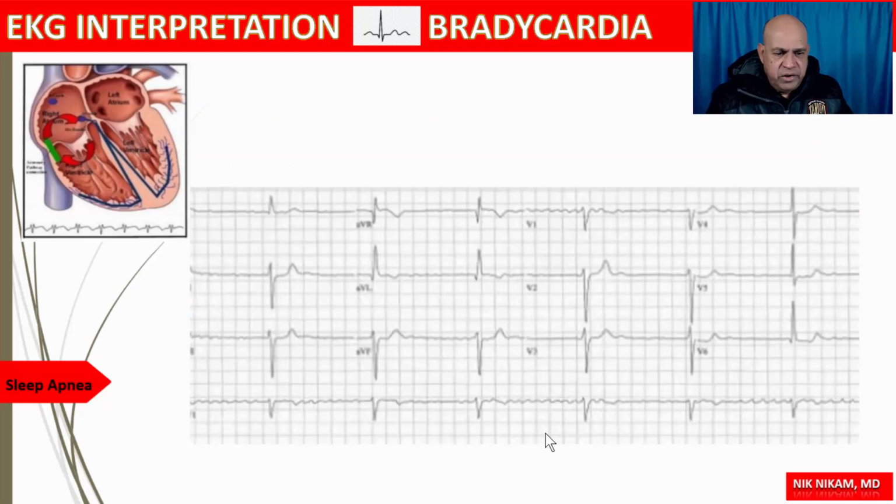I was talking about junctional rhythm just a few minutes ago. Whenever we see an atrial rhythm which looks like atrial fibrillation, and you see a fairly regular narrow QRS rhythm, you should always think about atrial fibrillation with escape junctional rhythm. When you see this, you should always consider the possibility of significant AV nodal disease, which may be compounded by drugs, which I already talked about: beta blockers, calcium channel blockers, or digoxin.